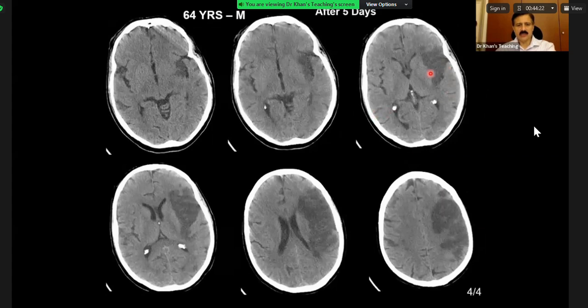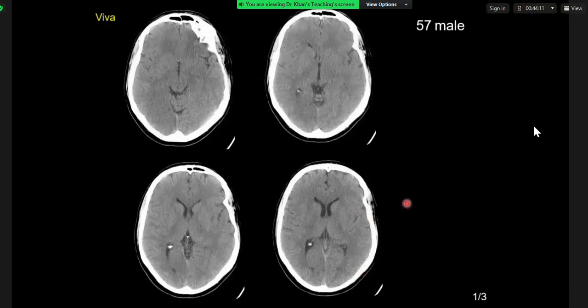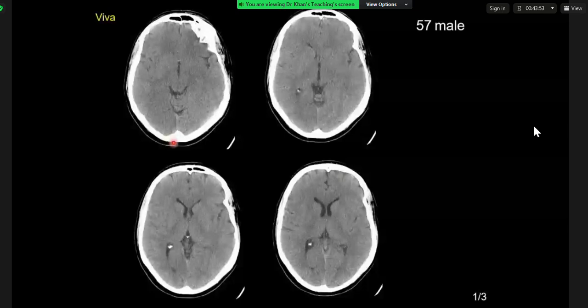After 5 days, this is what happened. Is there an acute infarction? This is a classical exam case. So there is loss of the normal sulcus, there's sulcus effacement on the left cerebral hemisphere. You mean to say, okay, left, somewhere here? The left side. Okay, yeah.